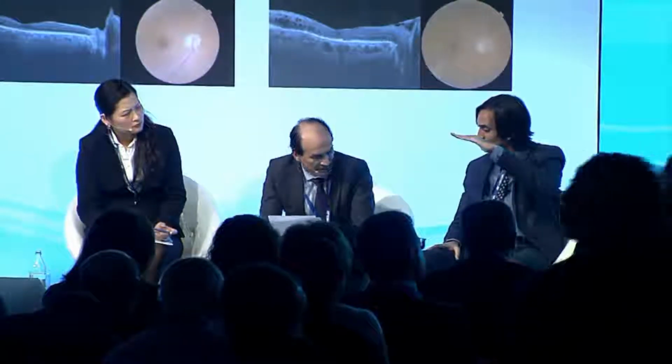One more question about therapy of dome-shaped maculopathy. I think it has been treated before. One question: vertical scans are also pathological in type 5 staphylomas, not only in dome-shaped maculopathy. Please. As you pointed out in your presentation, depending on the scan, you can see or you can miss the staphyloma and the dome-shaped macula.